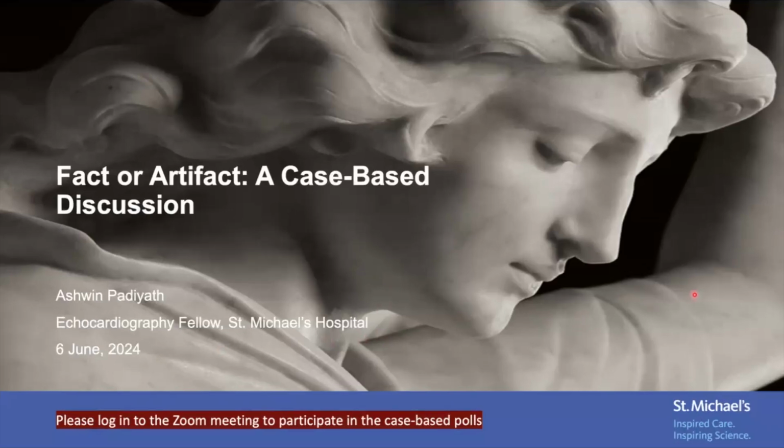Today we're going to work through a whole bunch of cases. The theme for the day is facts or artifacts. Are these real findings, or are they just a result of the ultrasound modality? We'll work through them together.